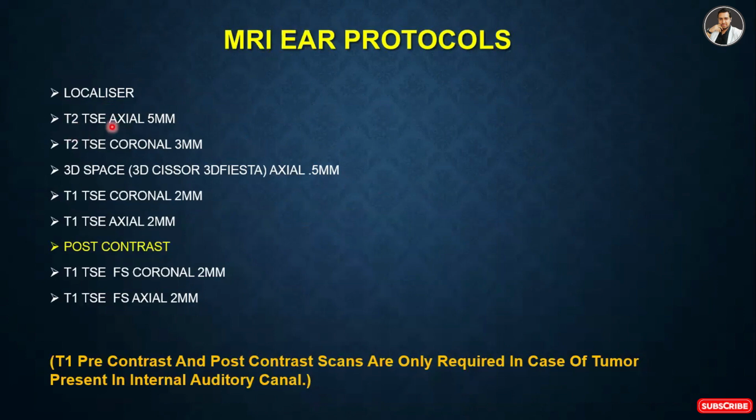T2 axial 5 mm. This is a brain protocol.